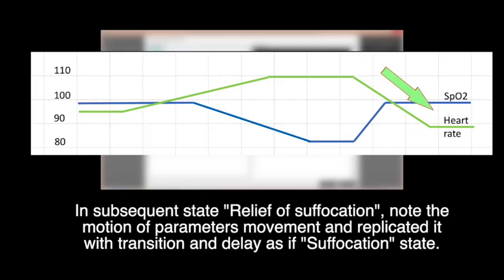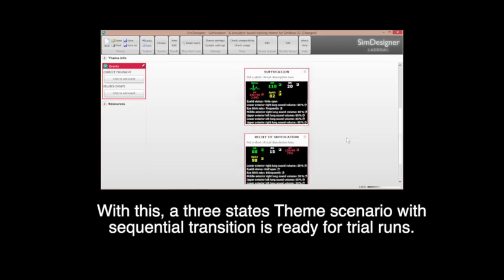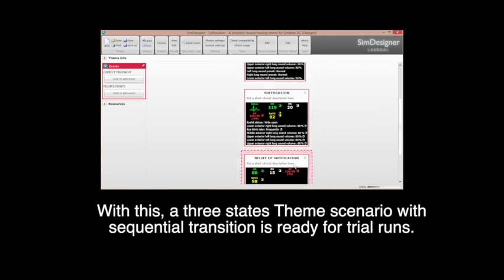In the subsequent state, relief of suffocation, note the motions and parameter movement and replicate it with transitions and delay as in the suffocation state. With this, a 3-state theme scenario with sequential transitions is ready for the trial runs.